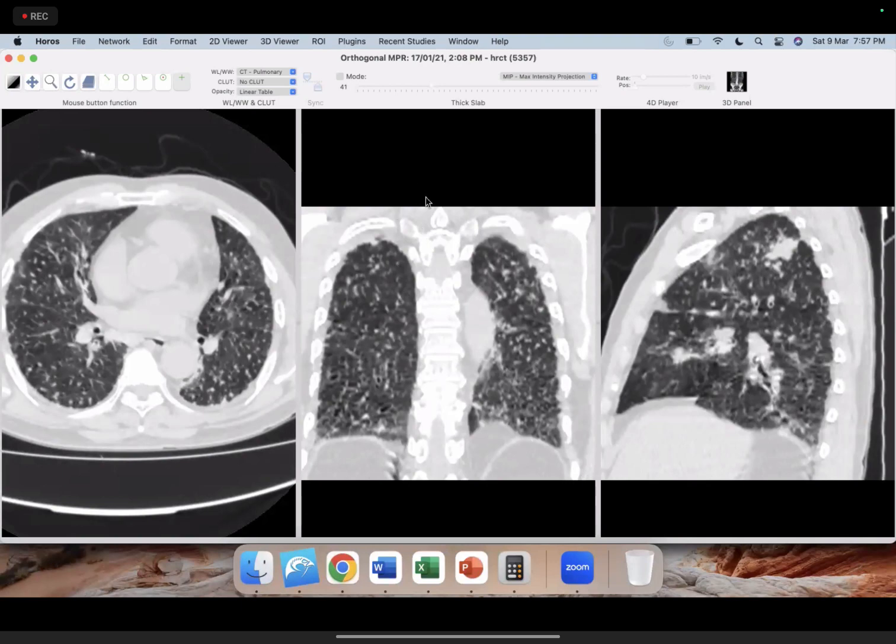Then, if a patient with a typical UIP pattern develops GG or consolidation due to infection or heart failure, how are we going to categorize? Again, that is not to categorize the ILD. This is now your superimposed complication. So that's what I said. Don't think that this is not fulfilling the definition because there is a GGO. GGO can be due to a superadded complication which can occur in an ILD patient just like any other. So it is still a background UIP with a superadded complication showing GG or consolidation. And of course, once it is treated, that will go away, but the underlying ILD will still be present.